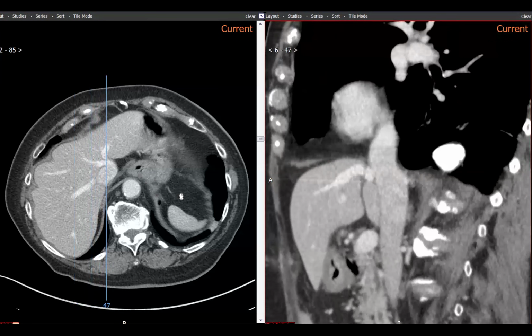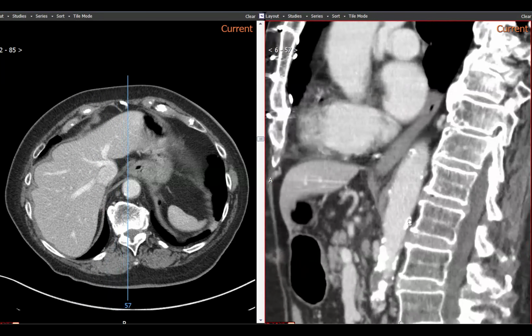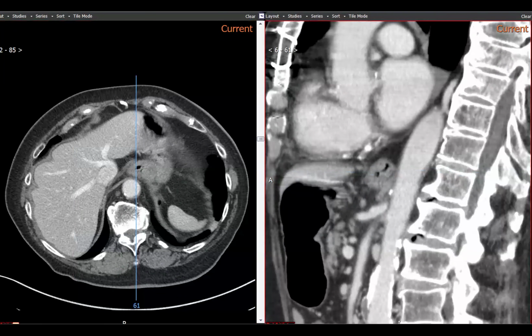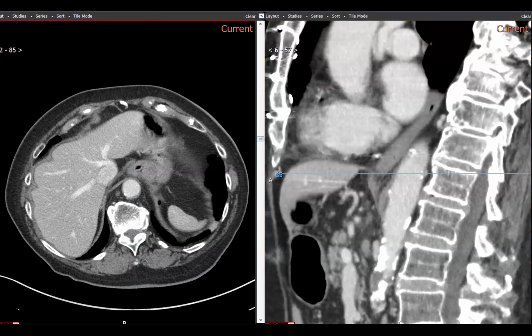What is that thing in front of the diaphragm? Partial duplication of the diaphragm. There's also a lot of inflammatory stuff anteriorly, like abdominal wall, but I'm getting distracted. Those are more patients with cholecystectomy and stuff. Oh wait, Yashant, tell us more about duplication of the diaphragm. I've never thought about that or heard of it.